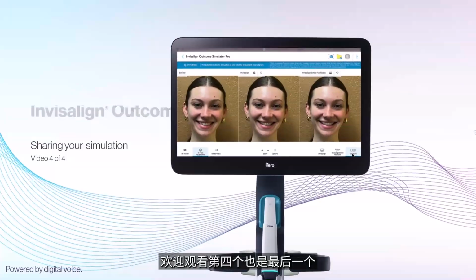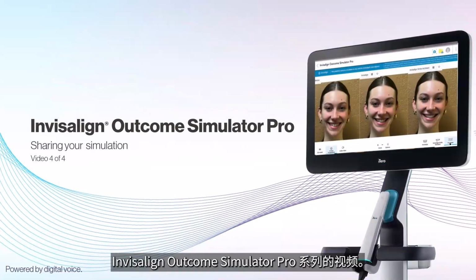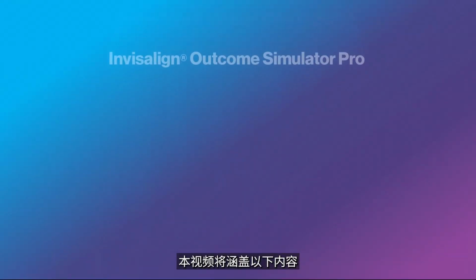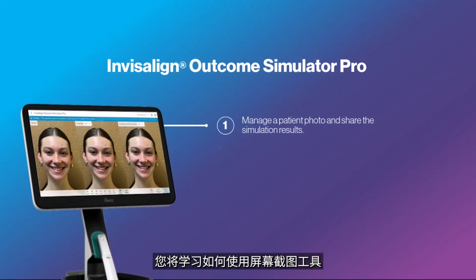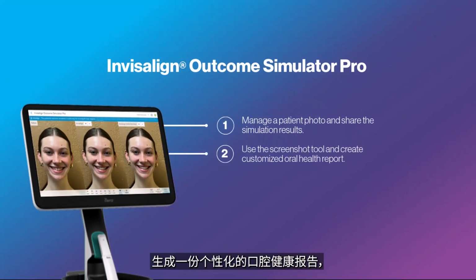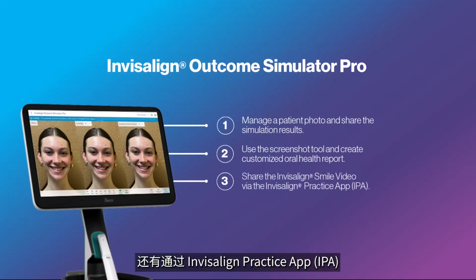Welcome to the fourth and final video in the Invisalign Outcome Simulator Pro series. In this video, we will cover how to manage patient photos and sharing the simulation. You will learn how to use the screenshot tool, create a customized oral health report, and share the Invisalign Smile video via the Invisalign Practice app, IPA.